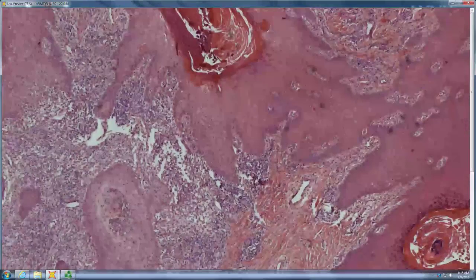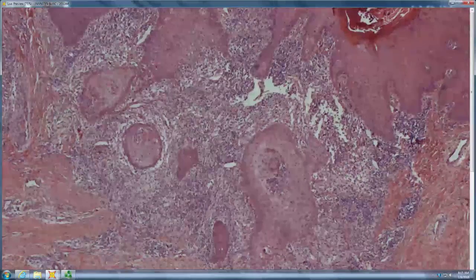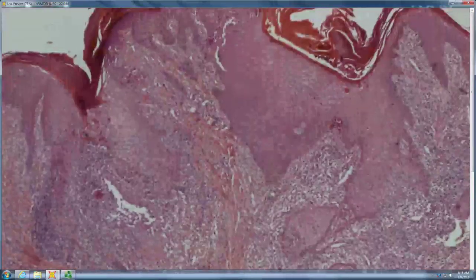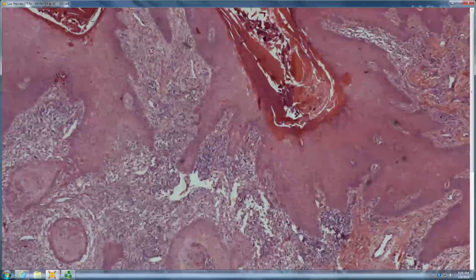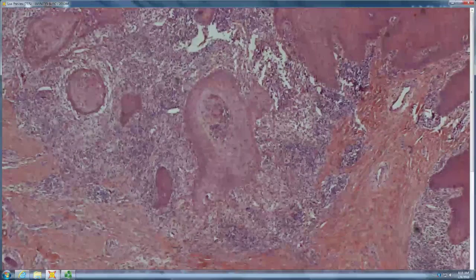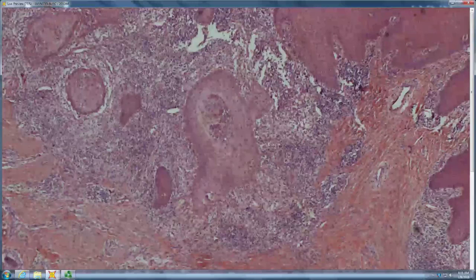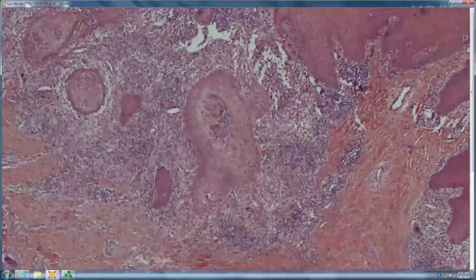Looks like lots of plasma cells. And how about your epidermis? So it's acanthotic. It's kind of papillomatous, maybe. So mild acanthosis, or to the point of pseudoepitheliomatous hyperplasia? To the point of pseudoepitheliomatous hyperplasia. And then there are neutrophils in it. Do you have a differential for PEH with pus? Sure. Halogenoderma, chromomycosis, blastomycosis, LGV, and pemphigus vegetans. Yes.